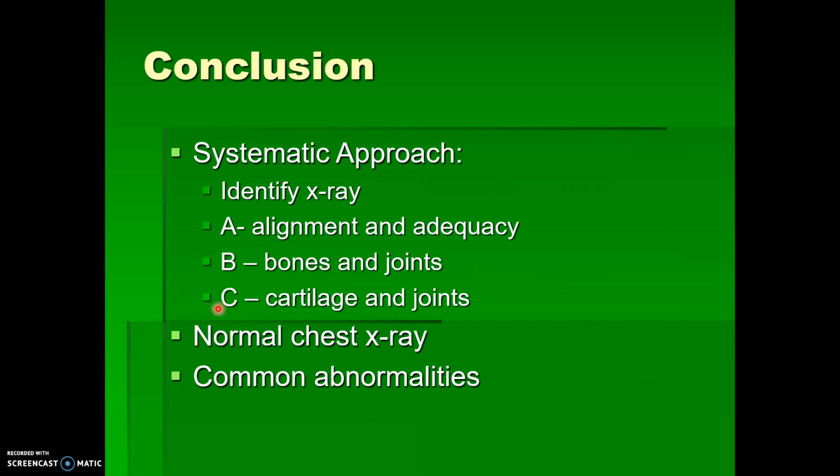So that was a little bit of application of the ABCD approach, and a little description of some common abnormalities you'll see. I would suggest you go back over this video, pause the video, apply the strict ABCD approach to describing each abnormality, and then describe the abnormality itself as thoroughly as you can.